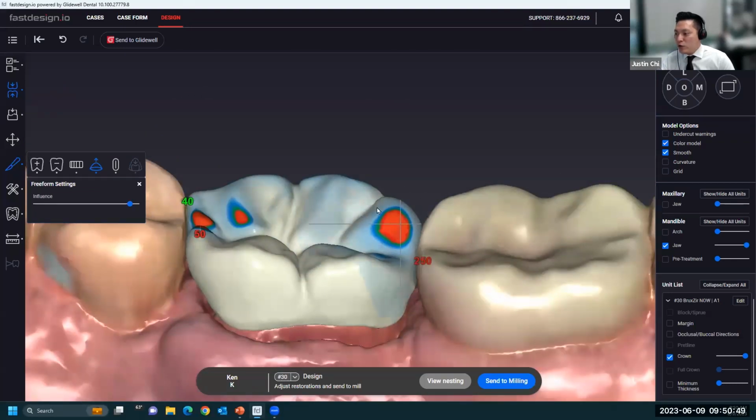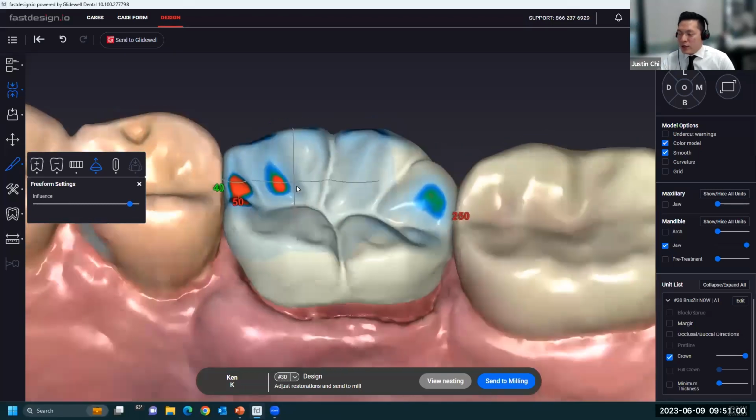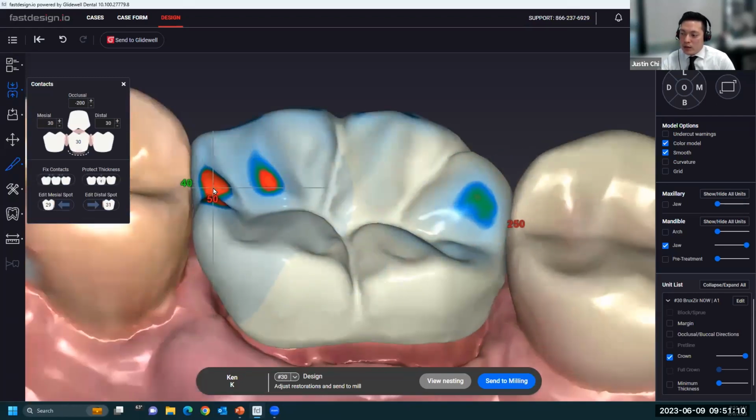I know by repositioning that distal cusp, I made it heavy. Let me take that down. Mesial marginal ridge is heavy, as we talked about. And notice how I made that contact heavy. So what we can do is let's return to the automated contact. And we can deactivate certain parts of the restoration. So we intentionally want the occlusal to be heavy on this mesial side.